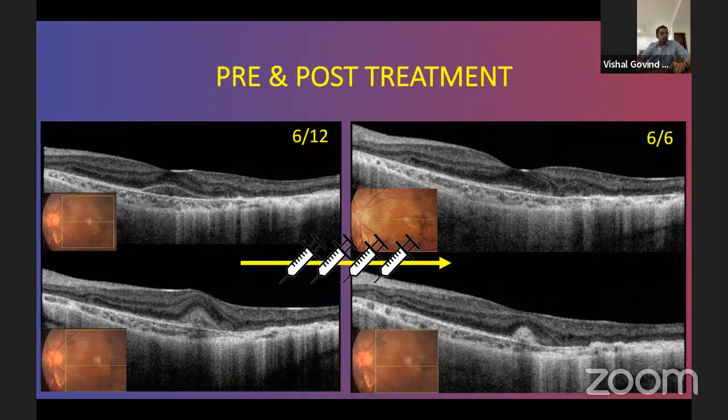And for you to differentiate, this case has been fantastically imaged, and the kind of presentation where you have an island of active retina has actually brought out that leak. And of course, there's a subretinal hemorrhage helping. But it becomes very challenging sometimes to pick up when you have a completely burnt out retina.